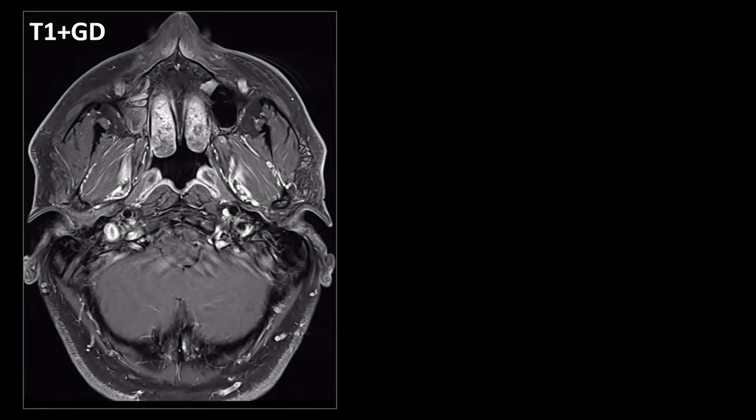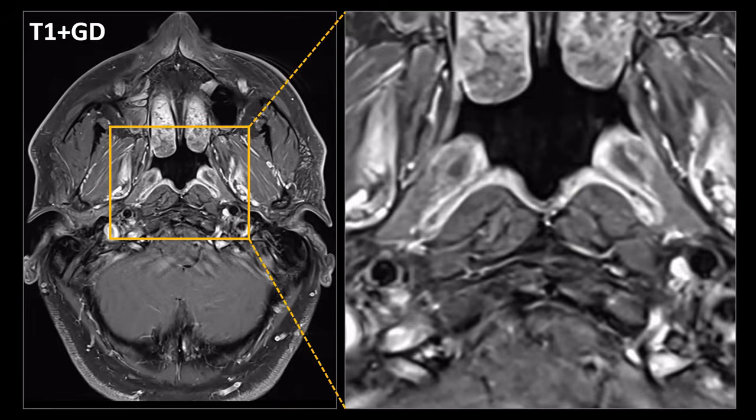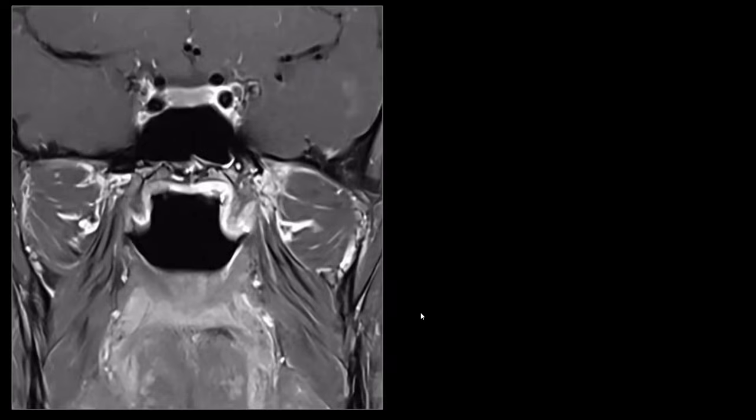This is a T1 weighted image with gadolinium and fat saturation. And if you magnify it a bit, we clearly see the Torus Tubarius, once again, laterally or along the lateral nasopharyngeal walls. And posteriorly, we see the longus capiti / colli muscles causing these elevations of the posterior nasopharyngeal wall. And remember, these are located in another neck space, namely the prevertebral space. The Torus Tubarius, however, is located inside the nasopharynx.